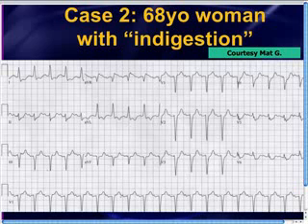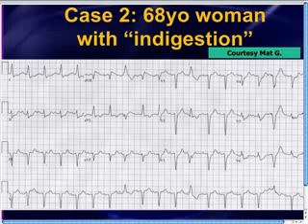All right. Well, the physicians that were taking care of this patient didn't necessarily do anything immediately with this. What they did was they repeated the 12-lead EKG just moments later, which is always very reasonable, to see if anything is evolving. And on the repeat 12-lead, again, there's still ST segment depression in a whole bunch of leads. There's also some PVCs that you've seen here. And Matt pointed out something very interesting about the PVCs. Normally, this is a normal PVC, all right? Just take a look at that for a second. In a normal PVC, you have discordance of the QRS and the T wave.